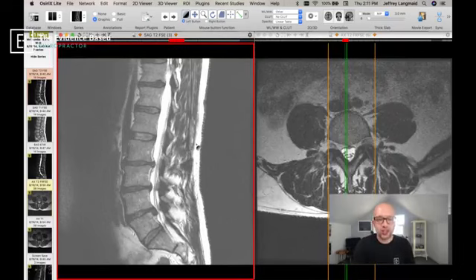On the left-hand side of the screen, that is a side view, a lateral view, or a sagittal view. They all mean the same thing. As if the person is facing sideways and the picture was taken from the side. So up in here is the tummy or stomach. We have the buttocks going down here, and the belt or the waistline would be right around here somewhere. And on the right-hand side of the screen is the axial view. Now keep in mind, with an axial view, it is looking up, not down, so left and right side are reversed. Always important to keep that in mind when reviewing MRIs.